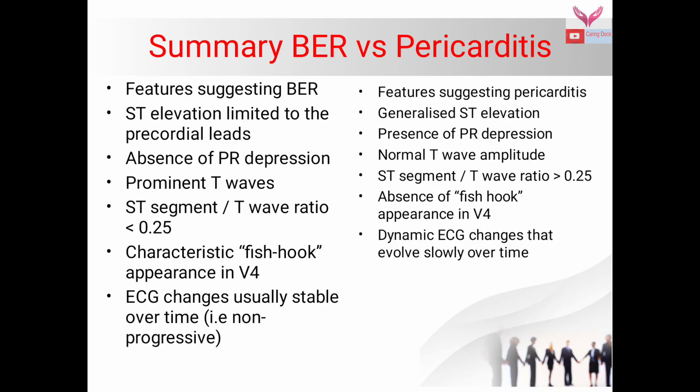So, in benign early repolarization, there is ST elevation limited to precordial leads, absence of PR depression, prominent T waves, ST segment T wave ratio less than 0.25, characteristic fish hook appearance in V4, and ECG changes usually stable over time, that is, they are non-progressive.